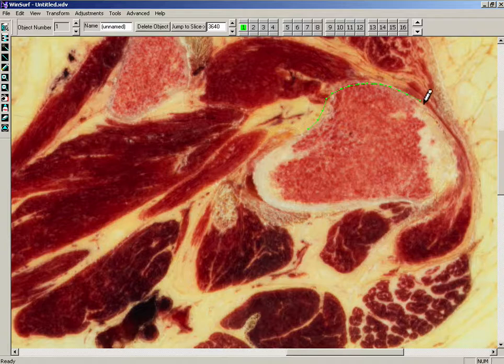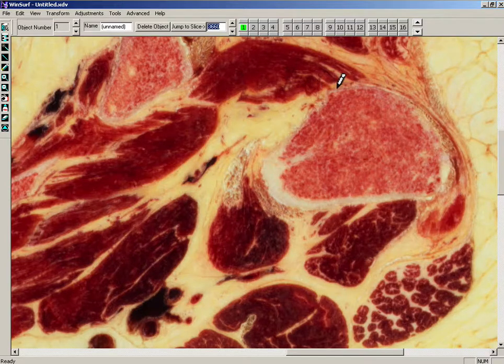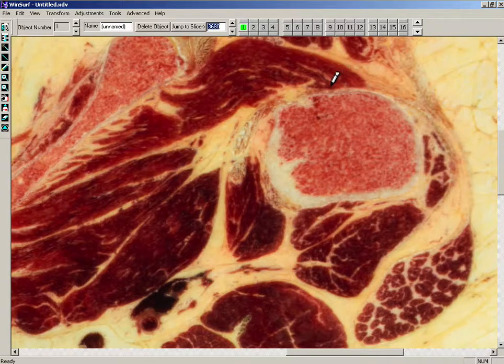In the regular organs or regular bones, you should enlarge the distance between the drawings in between the slices. This is to create a more regular mesh with a smoothing effect of the mesh here. So 20.